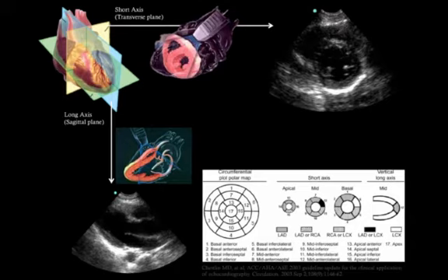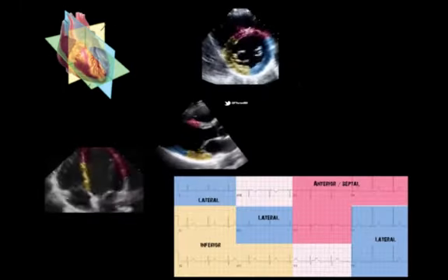Based on the views obtained in both transverse and sagittal planes of the heart, the American Society of Echocardiography has divided the left myocardial walls into 17 different segments. While this is shown to have better sensitivity than EKG, allowing a much more accurate assessment, this is complex and not designed for point-of-care sonographic evaluation in the emergency setting.